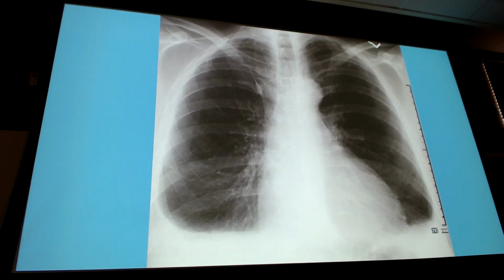So yes, cardiomegaly, and yes, a fissure, this guy right here. Now what do we know about our anatomy? Is there a fissure in this area of the right lung? Not really. Those were kind of here in the right lung, so here and here, or here and here. So what have we talked about that looks like this, in this kind of position, pointing down towards the mediastinum, that this could be?